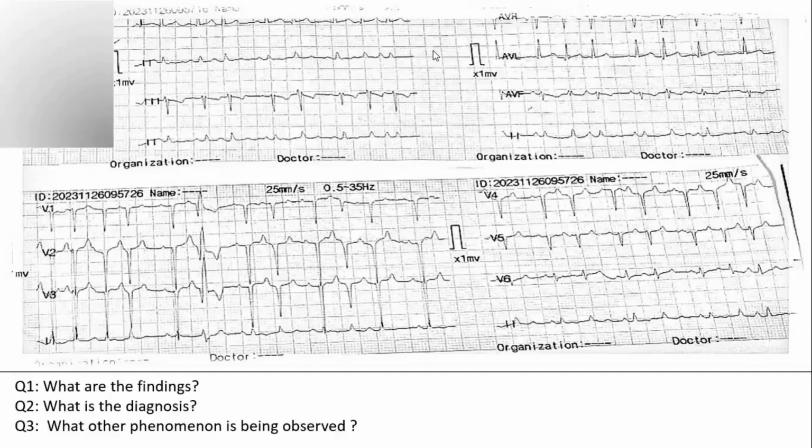Okay, anybody who would like to comment? So it's a tachyarrhythmia, right? Is it a narrow complex or a wide complex tachycardia? What do you think about it? Okay, I'll give you a hint. Look at chest lead V1.